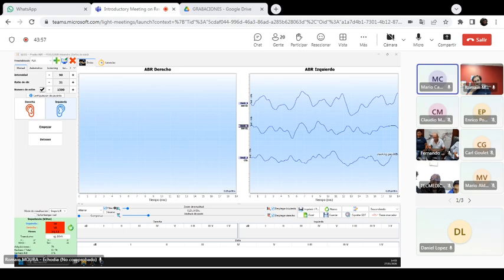We can guide you through this audiometry page, and in this way, we can prove to the commission that also the audiometry features are available, but disabled because they are not needed in order to execute ABR test and SSR and so on. Make sense for you? Yes, that would be perfect.